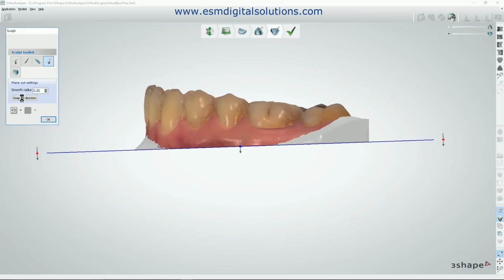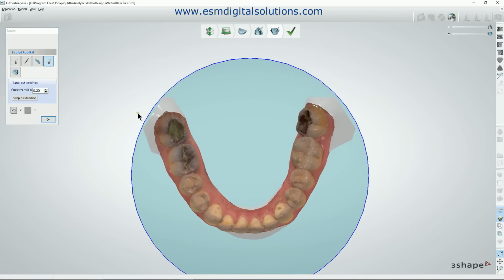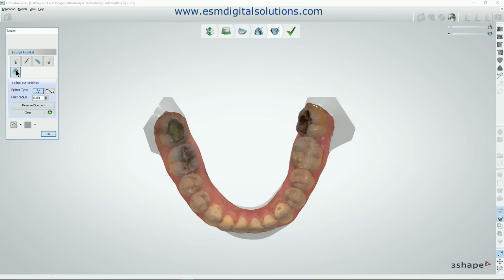Let's click on that again. There we go. And now we take a top view. And again, we have some material here we might like to get rid of here and here. So just to show you some other uses of this feature, if I clicked on my first point on the model, I highlighted the fact we must click off the model when we trimmed the upper arch. So now I click on the model. As I make my cut, the software is expecting me, and it requires that I close off the line that I produce. So the software is preempting that closing line.